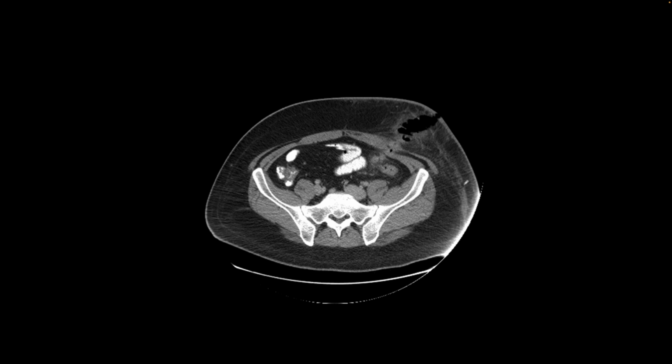This is our next patient, and they presented with abdominal pain, and previously they had an abscess which was drained by a percutaneous catheter, and the abscess resolved, the catheter was removed, but they presented a few weeks later with abdominal pain, and a CT scan was performed with oral contrast, which shows that there is fat stranding in the mesentery, and then that fat stranding and foci of air and some enhancement extend through the abdominal wall musculature into the subcutaneous space. So they developed an enterocutaneous fistula at the site where a catheter was previously placed.